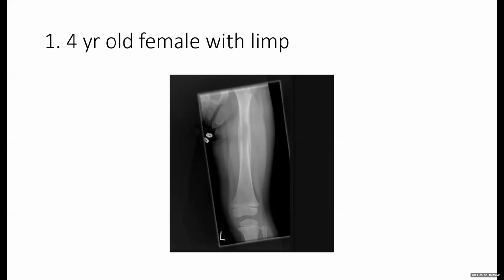I need MRI, if possible, to see how long it is infiltrated within the bone marrow. You want to go for orthogonal film? Okay, yeah, if there is, I will be happy to see another view. Yeah, there is a soft tissue swelling also around the lesion, but it is not so diffuse, it is localized. So I think this mostly goes with a neoplastic process like Ewing sarcoma.